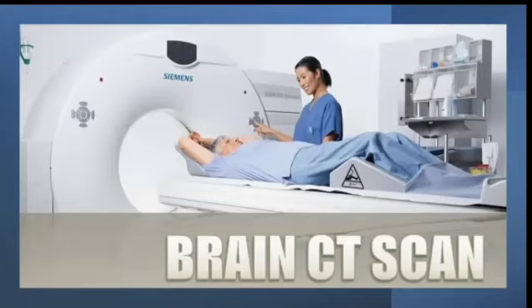I'm a resident physician at MTI University, and we will discuss brain CT imaging on today's lecture. As a future healthcare provider, it is essential to have a thorough understanding of the diagnostic tools available to us. In this session, we will explore the principles and clinical applications of brain CT imaging, which is one of the most commonly used imaging modalities for assessing various neurological conditions.